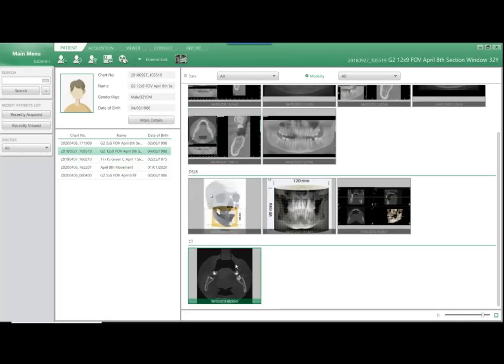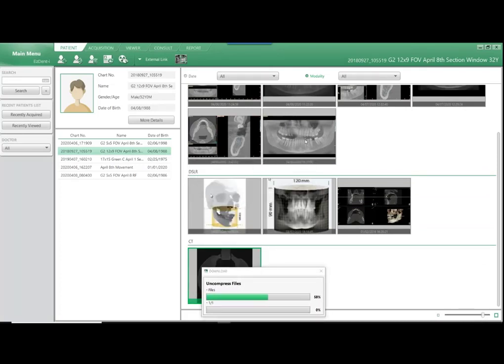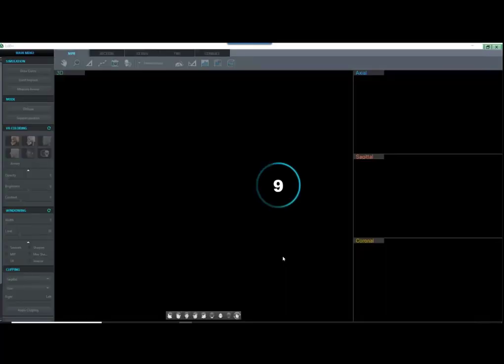Basically, when we're drawing the curve, and let me open up my 12:9 scan, the reason we want to draw our curve in the clockwise fashion is that we're going to get our reconstructed pan, which is going to look exactly like the pans we're used to seeing in 2-dimensional pan. Once this opens, we'll come back here and look at drawing the curve counterclockwise and what that renders for us. This will be open here in a second.